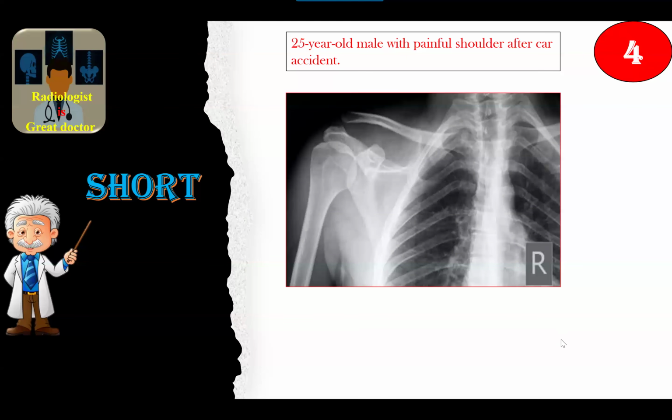Very good, boss. Another one, here is an abnormality. This is a displacement of the acromioclavicular joint, with superior displacement of the clavicle in relation to the acromion. The diagnosis should be different than the description. And also we have coracoclavicular ligament tear, resulting in increased coracoclavicular distance, suggesting ligamentous tear. Everything else is normal. Acromioclavicular dislocation. Again, review other films, and discuss with the clinician.